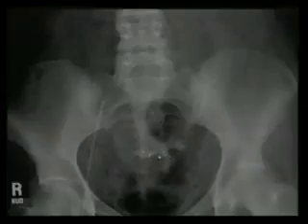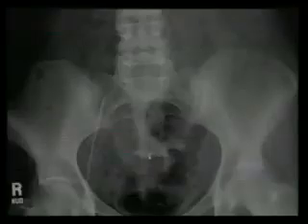Looks like an IUCD. IUD, yeah, intrauterine device. If they want to know where this is, does this tell them where it is? No. What do they need to do? Ultrasound, because that can migrate out, that can perforate. So we want to make sure it's in the endometrial stripe. But this at least shows you that it's in the midline. But correct, you can't say exactly where it is.